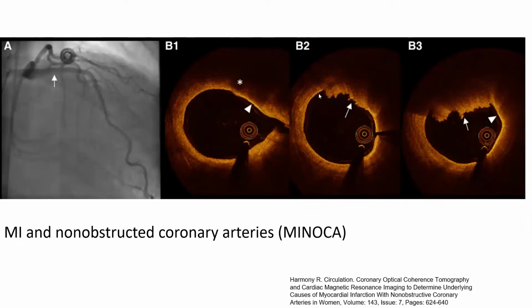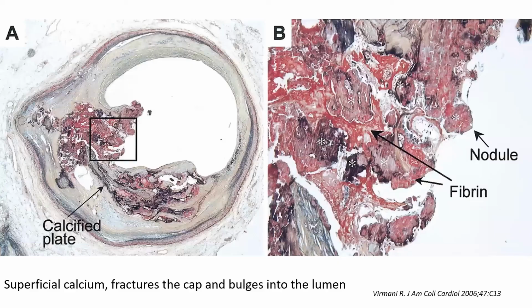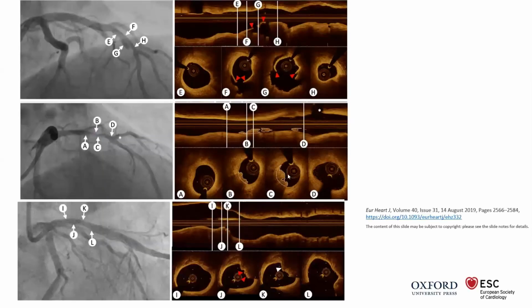Unlike, for example, here, it's not as smooth. But again, you could tell, well, maybe this is plaque erosion too. It's not always easy to tell. Just realize, not always easy to tell. But with time and practice, you'll be able to.